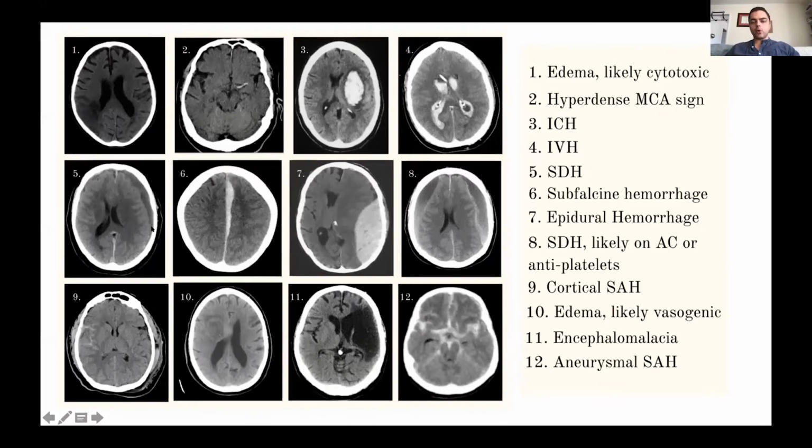Here, a more classic image that I'm sure has come up a lot in medical school, a subdural hematoma. It's likely chronic because it's hypodense. As blood ages, it liquefies, and so it becomes dark, more hypodense. Here we see an interhemispheric acute subdural.